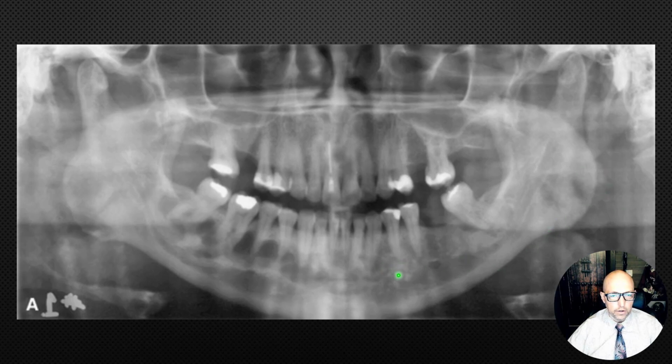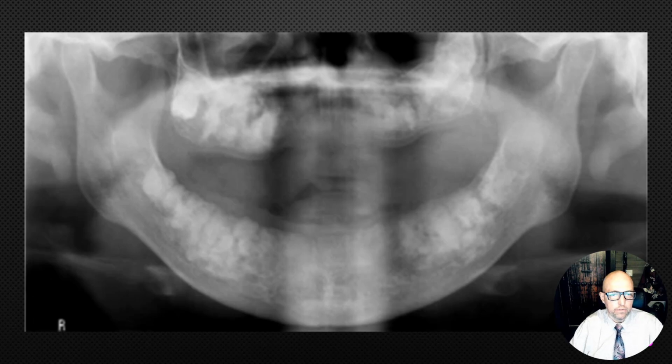If you look at other areas as well, something going on here, do they just happen to have a periapical lesion? Or is this more florid cemento-osseous dysplasia? Some more dense area here and lucent around that tooth. And so that's another example of florid. Here's one in an older patient. You see a cloudy appearance like this to the jaws. The first thing that may come to mind is Paget's disease, but it's really isolated to the periapical region of the teeth. And this is just very mature florid cemento-osseous dysplasia.